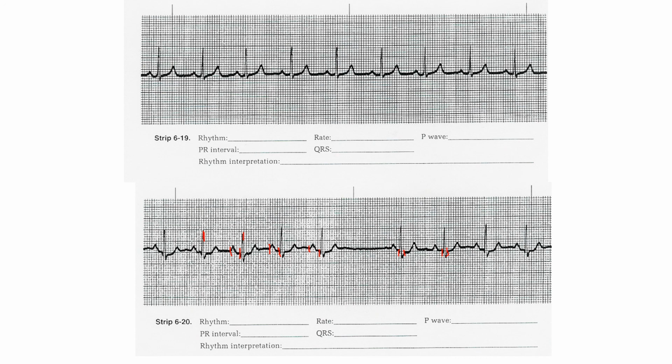And a QT interval. So I'm going to erase some of this stuff. So your QT interval would be the beginning of your QRS to the T wave. So it looks like about 0.38, maybe 0.36 to 0.38. So your QT is about 0.36 to 0.38. So when we have an interpretation for this rhythm, we are in sinus, right? We're in normal sinus rhythm because our heart rate is actually 88 as a baseline. And we have a pause.